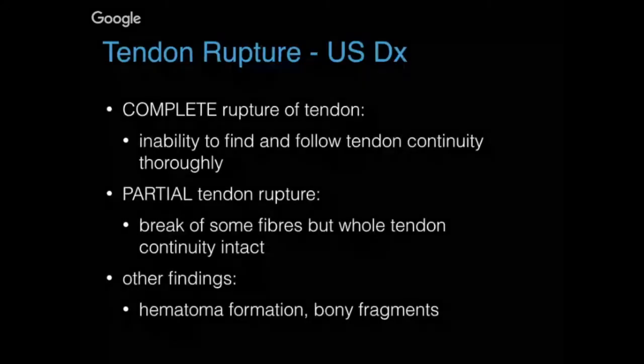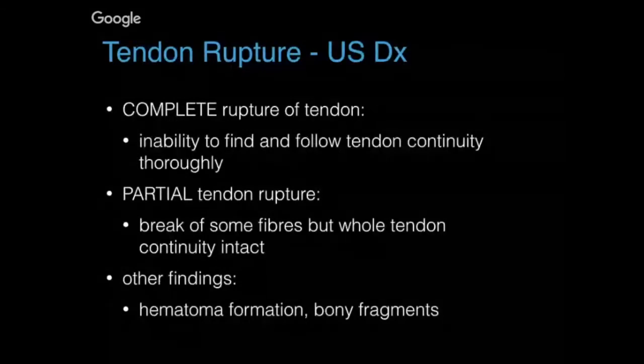And then the last topic is around tendon injury, which is something that in pediatric practice maybe we're a little bit less familiar with because we don't see it as commonly as we do in the adult population. But the concept of it seems pretty straightforward. On ultrasound, tendon bundles appear as echogenic parallel lines with fibrillary appearance.